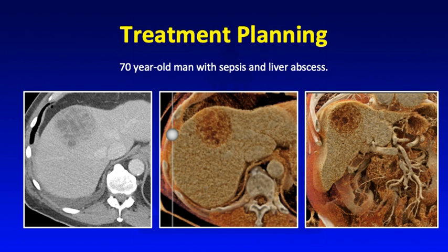And when we look at this example here of a liver abscess, on the axial images, we can see that it's multiloculated. There are multiple internal septations. There are many cystic spaces within this abscess. But when we look at the cinematic rendered image, we can appreciate those multiloculated internal septations much better compared to the axial image. Based on the cinematic rendered images, we would expect that this abscess may be rather difficult to drain because there are many tiny pockets rather than one dominant pocket. And indeed, when they went in to try to aspirate this abscess, they got very little fluid out of it.